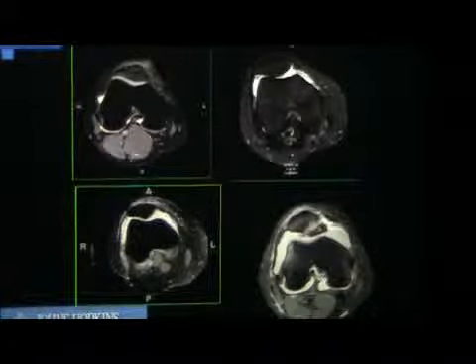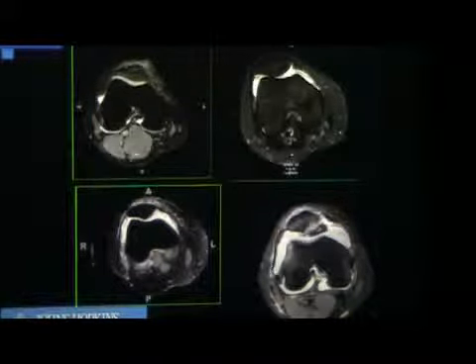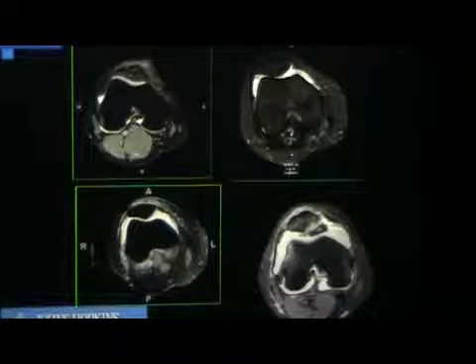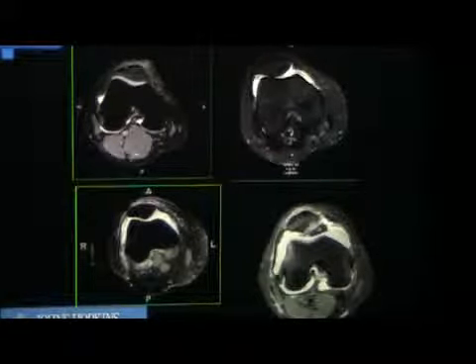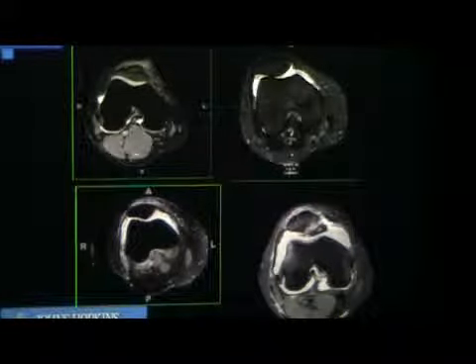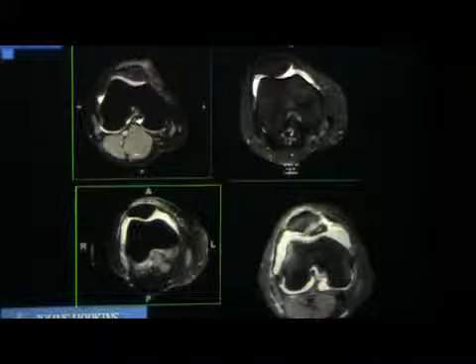That helps you. For me, trabeculations help me to decide, if I see a deformity or a lesion in the bone, whether I'm thinking developmental or acquired. Because I know if it's developmental, bone is deformed, but the trabeculations will be there. If it's something acquired, trauma, infection, fracture, tumor, something happened, the trabeculations will be destroyed. So it's acquired stuff. So that's where it helps me. Okay. All right.